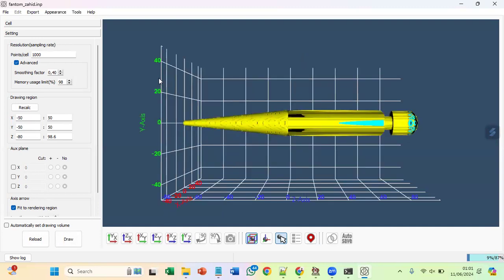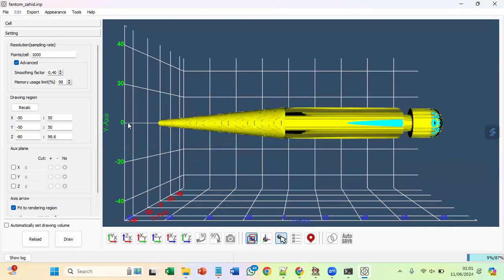So this vertical part is the y value. If you set from 0 to 10, you only measure the upper half. So make sure if you want to make it 10, so from negative 10 to 10. Okay.